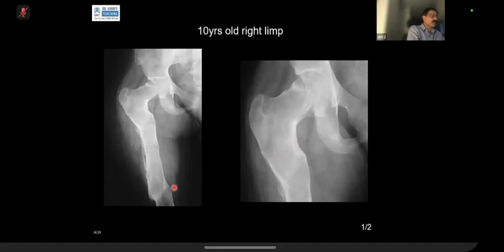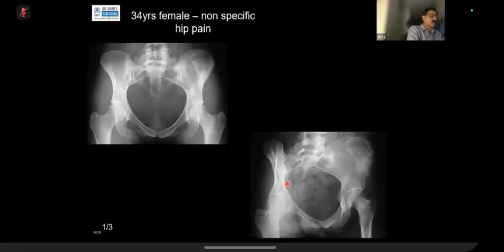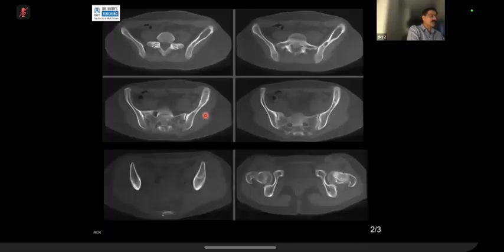Another case here, and this is a case where it tells you a story. There is a deformity. There is evidence of previous surgery, shepherd crook deformity. But look at the medullary cavity. Medullary cavity is gone. It's all obliterated with this ground glass appearance. Polyostotic fibrous dysplasia, something here, and something here. And you have got that marginal sclerosis. CT of the same patient, and in the center you have got a lytic area and marginal sclerosis.